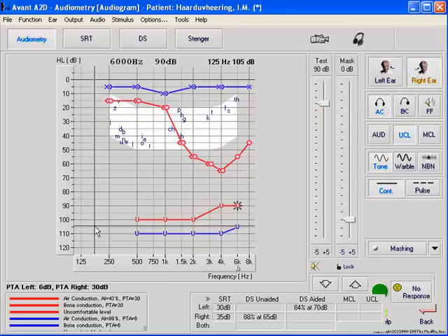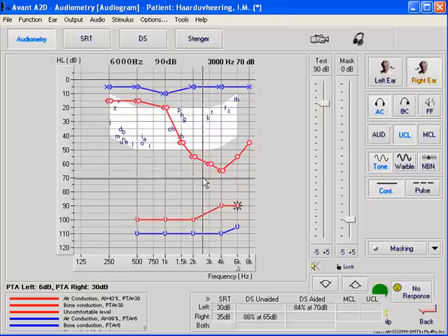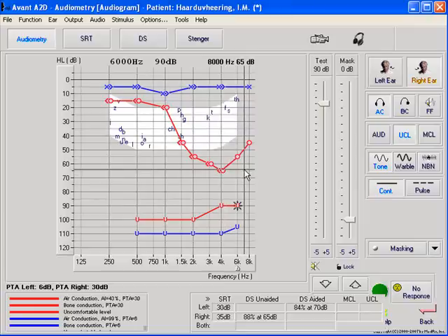In the right ear, however, the patient begins to lose audibility in the mid to high frequency range. This causes soft sounds to be completely inaudible for higher frequencies, and even normal conversational speech will be challenging for this person to hear. In addition, their UCLs are reduced, and therefore their tolerance for loud sounds is similarly reduced. This narrow and distorted dynamic range creates a significant challenge for hearing instrument fitting.